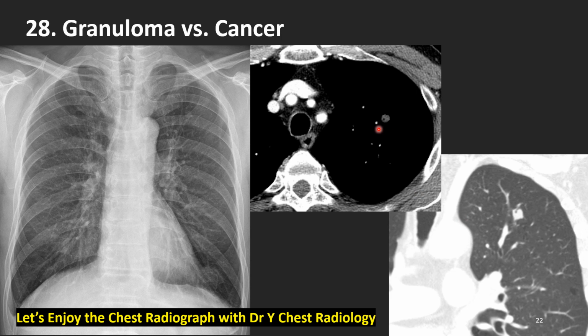Nodule is always a problem for us in interpreting because we always think about the cancer. Nodule can be cancer, lung cancer, so it is not easy to differentiate a single nodule between granuloma and lung cancer.